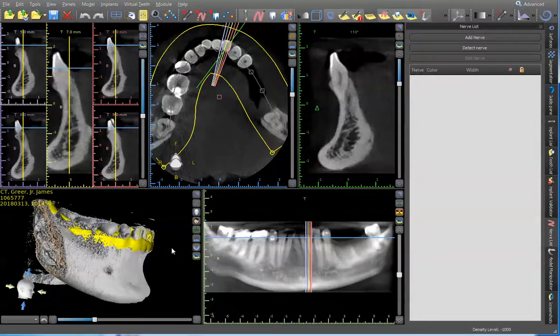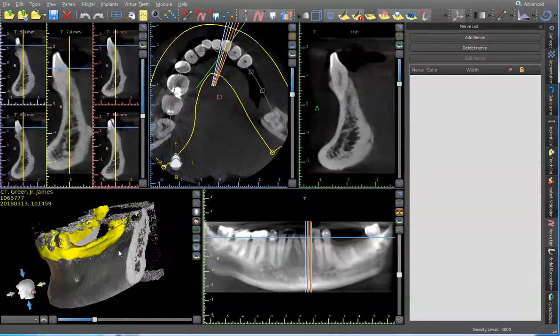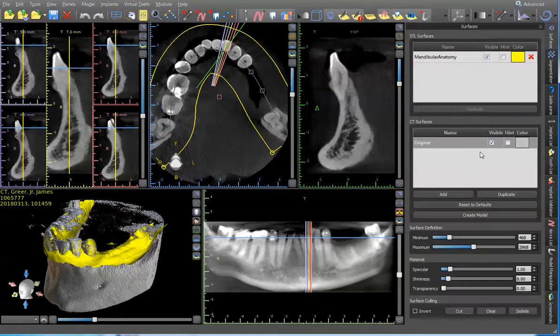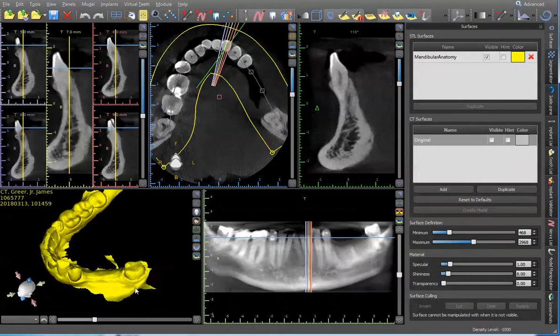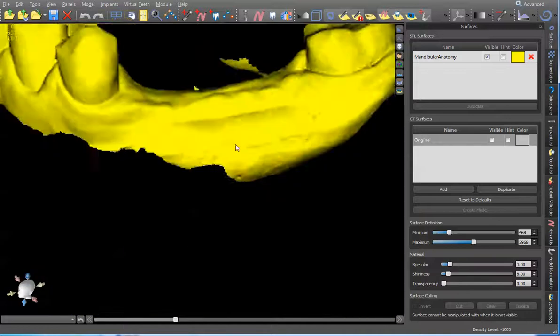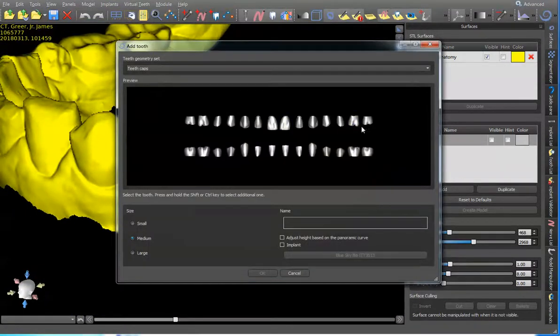This patient had some extractions done on the lower left quadrant 5.5 months ago, in sites number 18, 19, and 20, from what the referral dentist told me. So here's a CT image, and I'm going to turn off the CT scan after they're stitched. He did all the stitching and sent me this case. And I'm going to add initially some teeth here, to see what 3 teeth would look like.